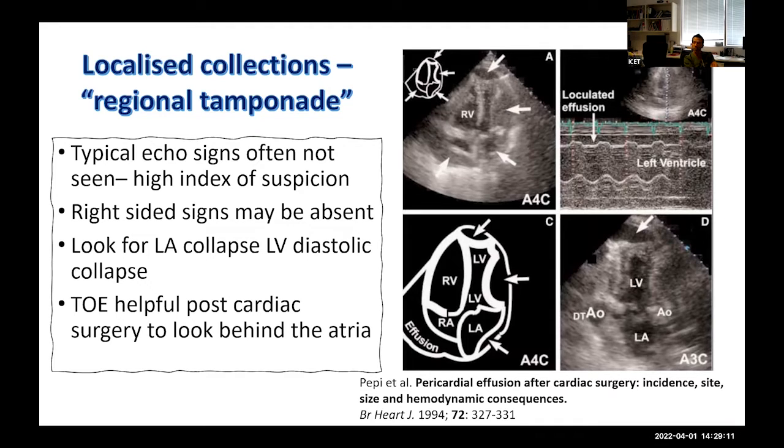After bypass, you won't even get very good views from all the scarring, drains, staples, sutures, blood. Well, that's transthoracic views. Yeah, transthoracic. But also because you can see behind the atrium a bit better.